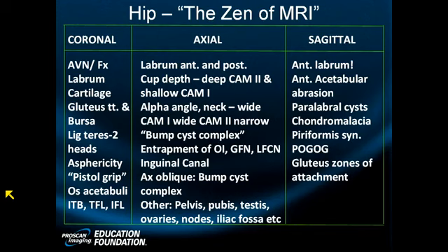Notice that not a single one of these has gotten arthrography. I have weaned every one of my surgeons off hip arthrography. And that was not easy to do. Look at the medial lateral direction and dimension of this tear. We're in tight, looks good.